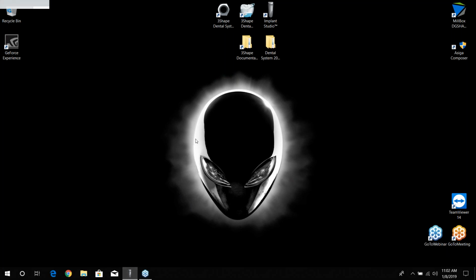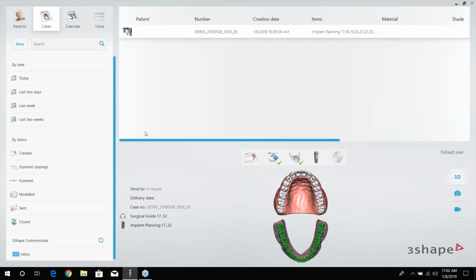All right, sounds good to me. So today we're just going to be covering the Edentulous guide option. There is an Implant Studio 101 webinar from last year that covers tooth-borne guides. So if you want to see some of the more dialed down, what button to push, how to manipulate certain things, that's all covered in the 101. Today, it's going to be more of a high-level overview of the Edentulous, just because there is more to this workflow, so it takes a little bit more time.